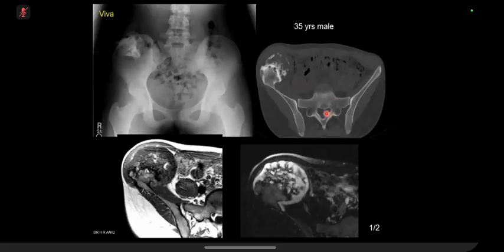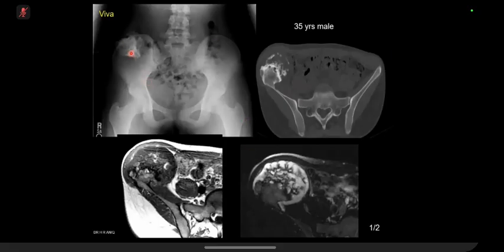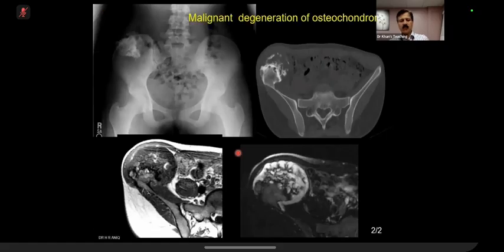Well done. Now, this kind of a case, because of time factor, I put that together. But just a recap, the examiner is going to show this to you, and you will pick up an osteochondroma, and the leading thing might be that there is a bit of pain. CT has got nil role. Don't ask for a CT, right? Ask for an MR. And on MR, this cartilage cap is thickened, means malignant transformation, means bone tumor center referral. So these kinds of cases have come in the exam again and again.